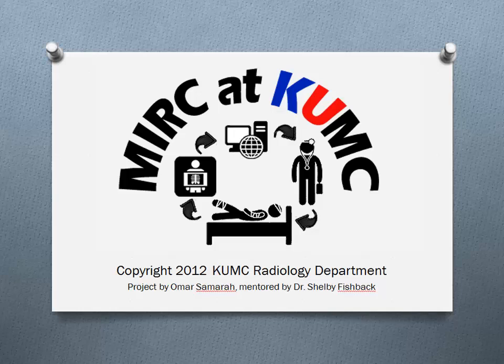If you'd like to create more robust teaching files, however, see the next tutorial, Making Better Teaching Files, or check out the tutorial on Annotating Images. The goals of this tutorial are to create an empty teaching file, add content and save the teaching file, and to view and publish the teaching file.